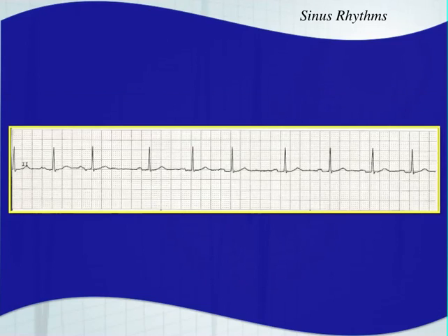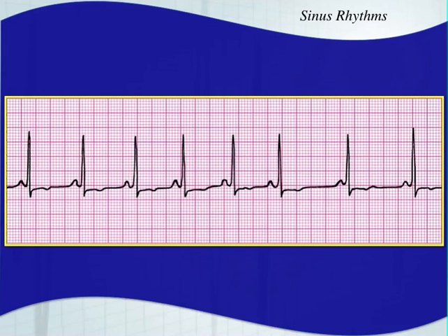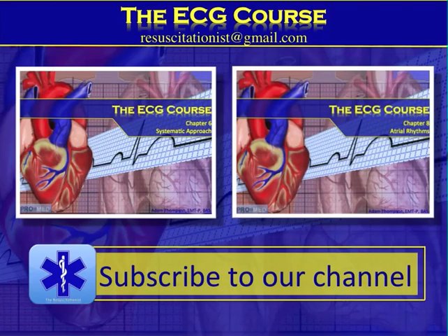Here's another quick example. All right, you have P waves, QRS complexes, no extra P waves. Your PR interval stays consistent, and your QRS complex stays narrow. It's called sinus arrhythmia. And then just one final example. I'm trying to show you as many examples as possible so you can see that this looks different on different patients. It's not always going to look the same, and that's a hard concept to grasp about EKGs. A normal sinus rhythm on one patient will look completely different than a normal sinus rhythm on another patient, and that's just because there's all kinds of stuff at play. You have the way the leads are set up, you have the size of the patient, you have the voltage of the heart, the depolarization that occurs. All kinds of different things may change the way it looks. And then you could be looking at it from different leads, which could also change the way it looks.